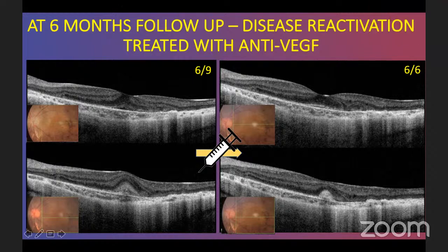Yeah, so they do tend to be more classic, but this is again extremely anecdotal and it's not fair to make statements along these lines. But yes, because of the way they respond and the way they appear on the OCT, they do tend to be predominantly subretinal in location. And intraretinal fluid can be a sign which happens quite late in the course.